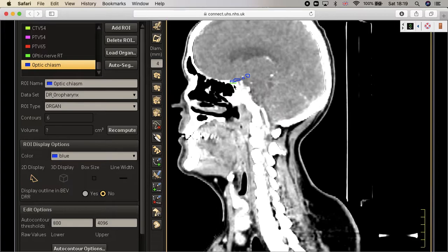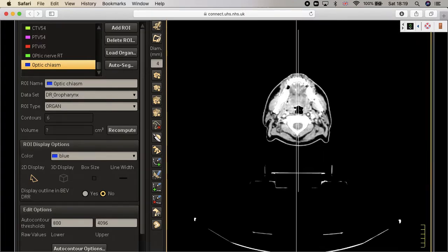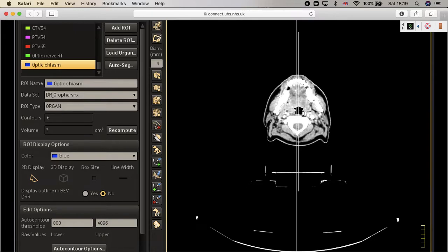So you can see it here. So if you see this picture that the optic chiasm is joining the optic nerve at a certain point, I'm happy with that, because the optimizer can never put any dose there, because I will protect the area, and especially if you're putting a PRV of 2 millimeter around it, so we're 100% sure that this area is safe and you don't have to worry. And this is how we draw the optic chiasm on a CT. I hope this is number one. This is a useful trick, and thanks to Frank Lohr.